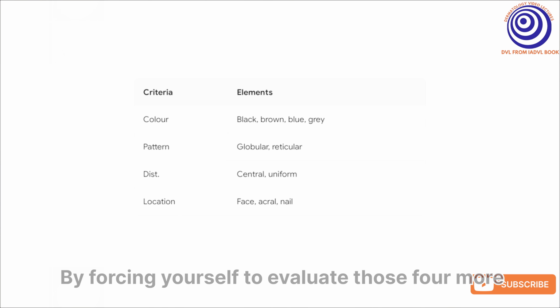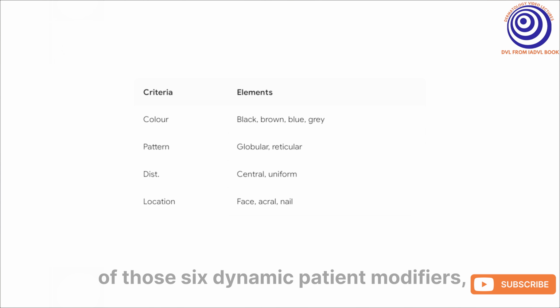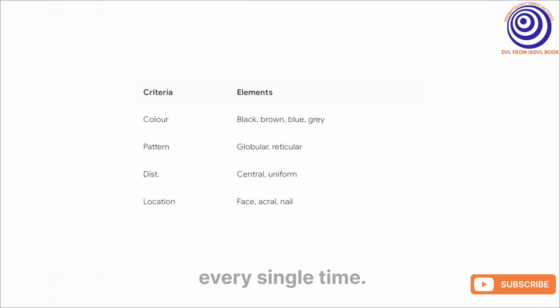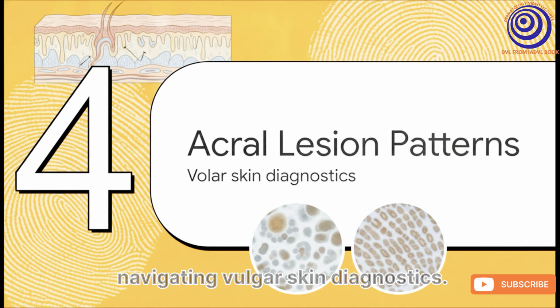By forcing yourself to evaluate those 4 morphological pillars directly through the lens of those 6 dynamic patient modifiers, you're guaranteeing an evidence-based evaluation every single time. Section 4, acral lesion pattern recognition, navigating volar skin diagnostics.